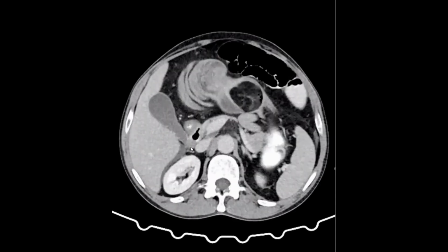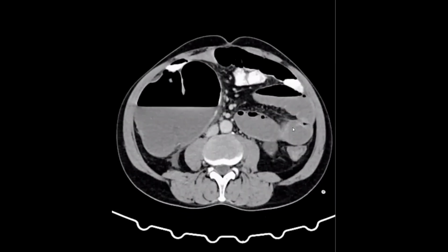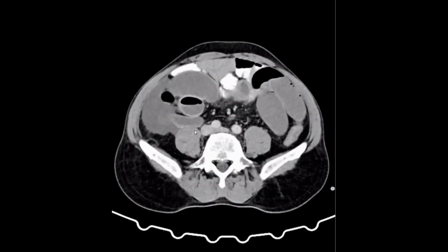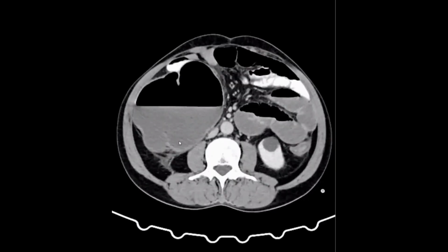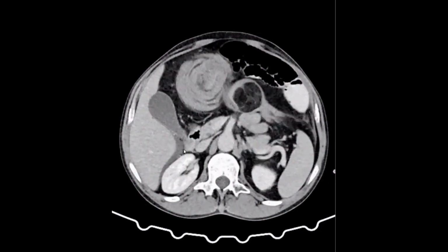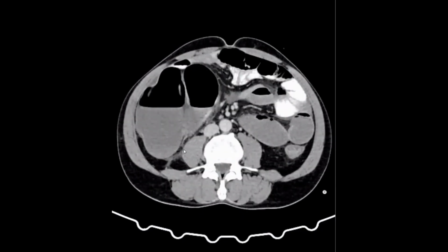And as you said, we don't have any evidence of ischemia. We have a large bowel obstruction and also small bowel obstruction, mixed large and small. We have also free fluid collection. So this is a case of intussusception. Colonic intussusception causing small and large bowel obstruction. Okay, thank you so much, candidate number 7.